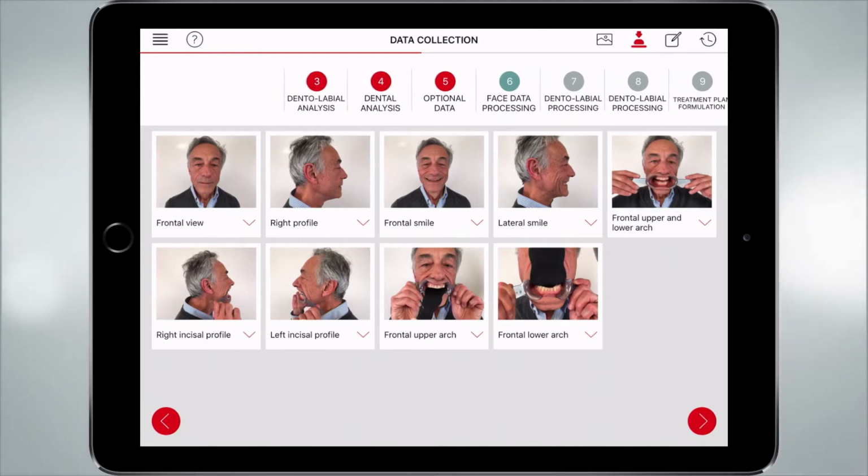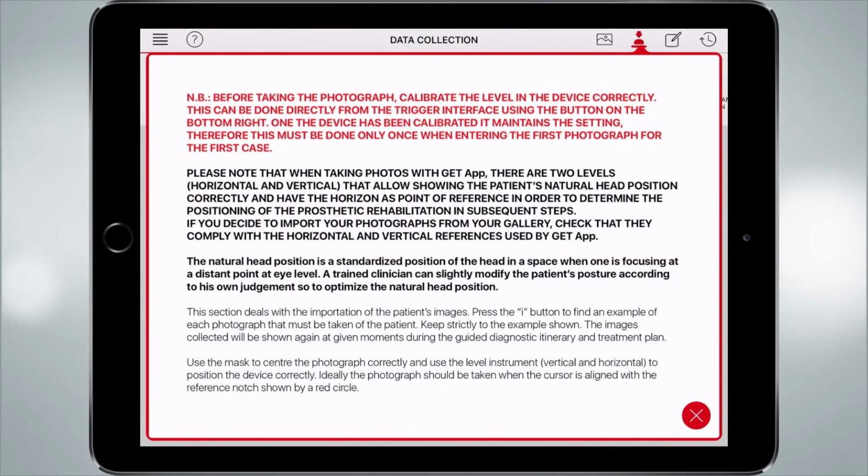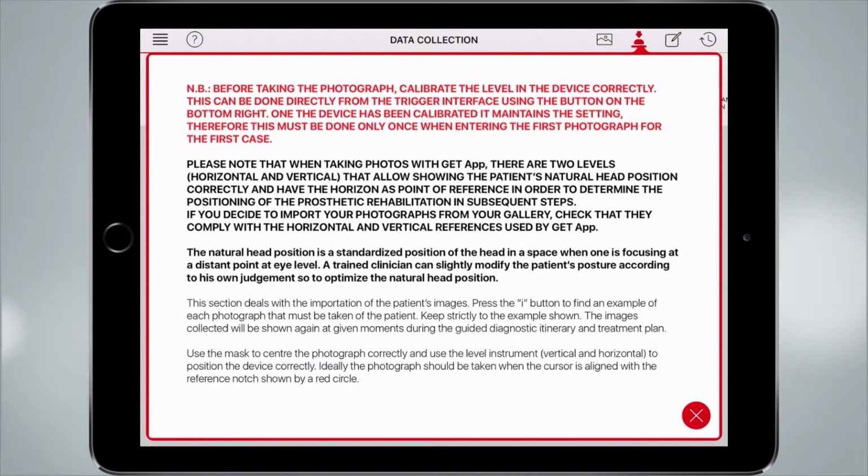More than that, you can find, close to the red button that you have seen already, something that explains to you, as you have seen, all this information about how to take the picture, etc., all the information of that screenshot. You have to remember that this red button is present in every screenshot.